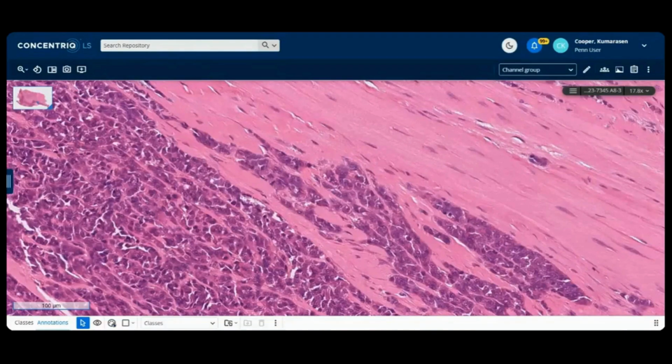Myepithelial comes to mind. Yes, pink cells, cords, nests, myepithelial markers, and melanoma, right? We have melanoma as well. And if you had melanoma, then you would do the S100. And S100 is also a marker for myepithelial cells, as you know. But in addition, for myepithelioma, you want epithelial, so keratin and EMA, and then the myo components.